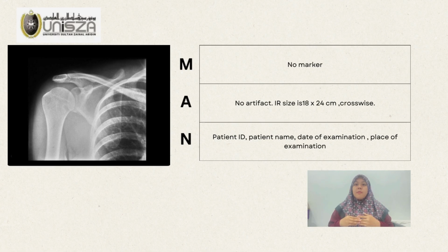All in all, this image is rejected because there is no marker, no patient ID, no date of examination, no patient name, and no place of examination here.